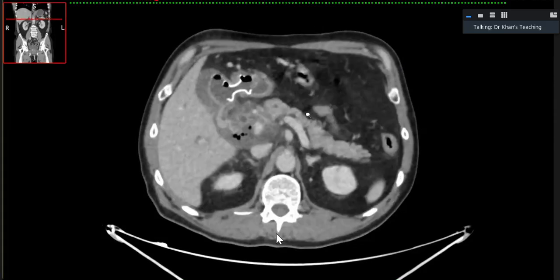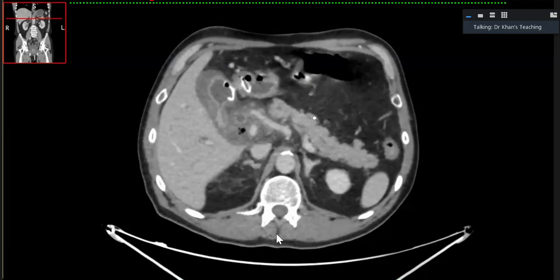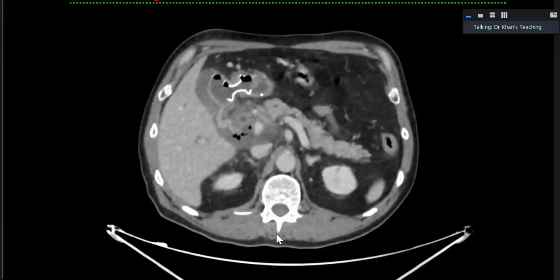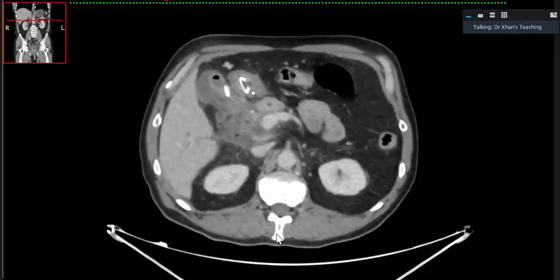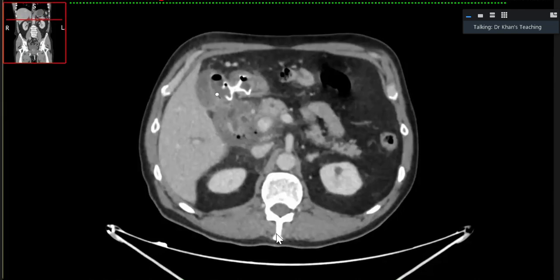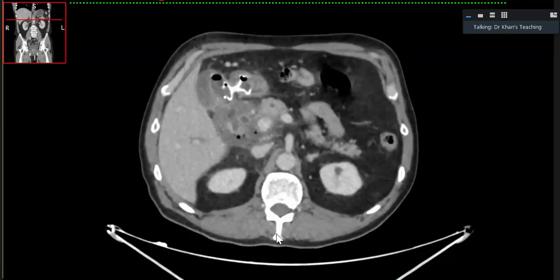It tells you a story. And the story is that a gastroenterologist has passed this Axios stent from the pyloric canal to the gallbladder. So biliary gastric drainage or fistula. And with that, you can see that there is pneumobilia, etc. I'll come back to that aspect.